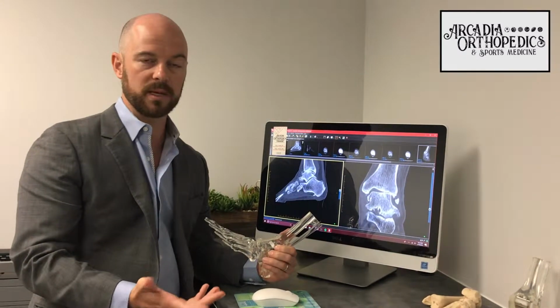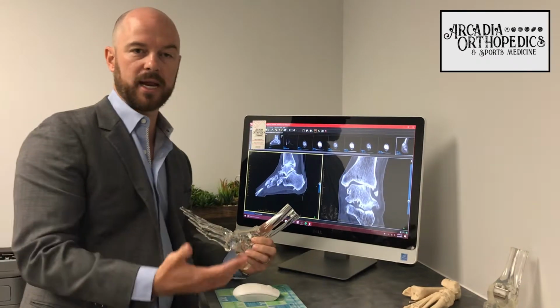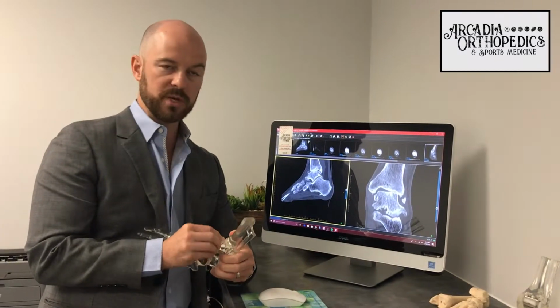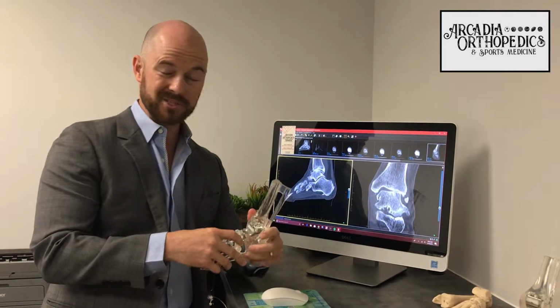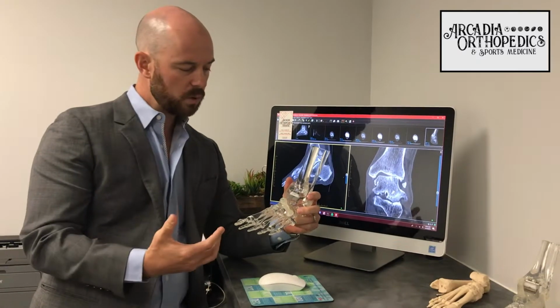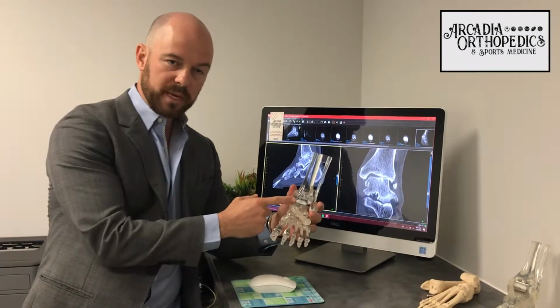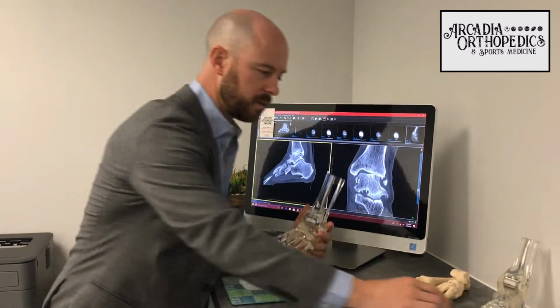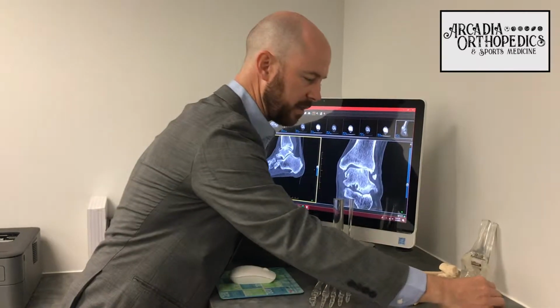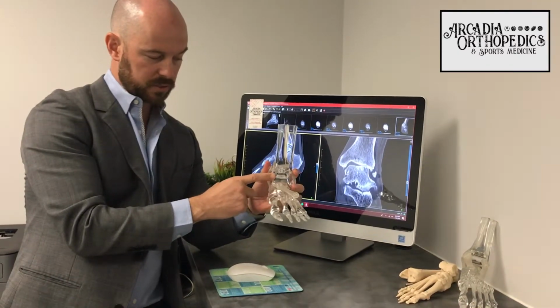An ankle fusion can be debilitating. It was the gold standard and has become a second option for patients because the technology has improved. So there's really two different types of ankle replacements. There's about 10 on the market as of later this year. But what we're going to talk about is a semi-constrained or two-piece component versus a mobile-bearing component. And this has three pieces. So first we'll talk about the semi-constrained total ankle, and that's what this looks like.